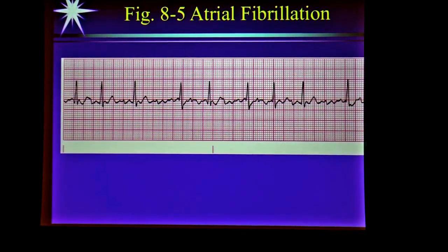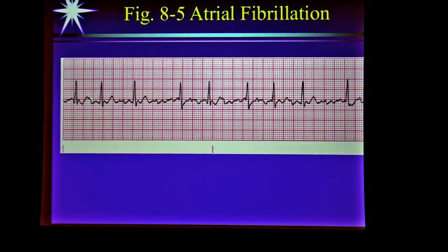No. But why can't this be artifact with PACs? And the answer is, it could be, right? Why can't you just have somebody shaking, which is what's screwing up the flat line there, and the reason it's irregular is somebody's throwing some PACs? Why can't it be that this is all normal, and then this one is extra or something like that?